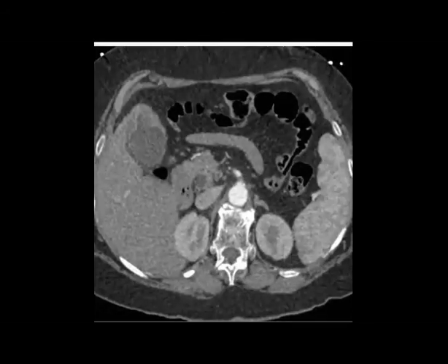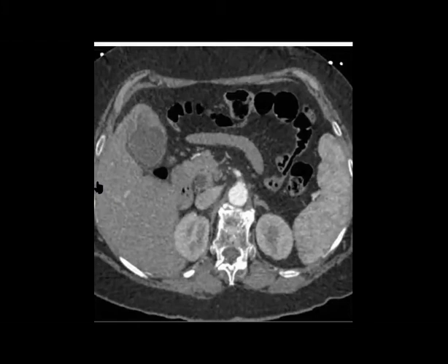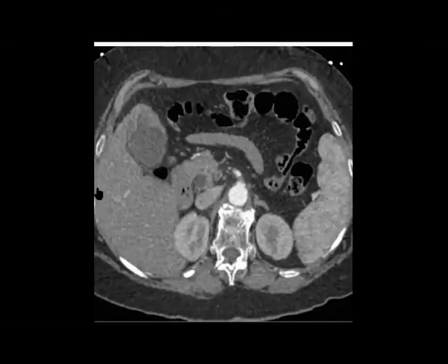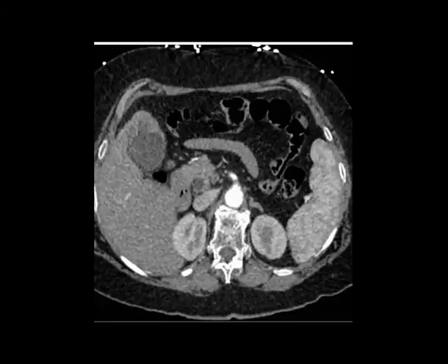Okay, so what do you think about this case? Do you see an abnormality? No? Check again, Sarah. Nermeen, don't rush to the answer, especially in the long cases, because sometimes it blocks you from checking for anything else.